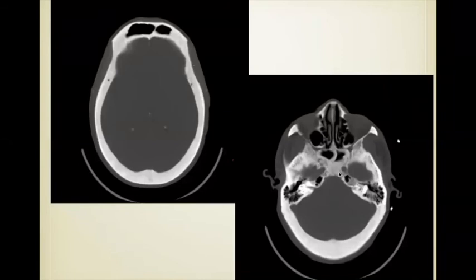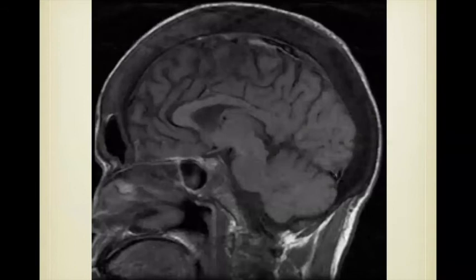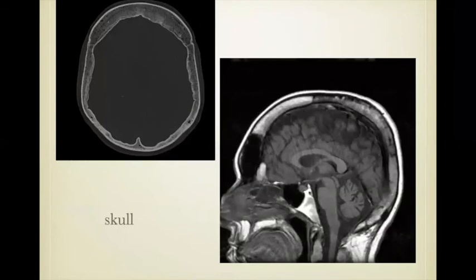Notice how dense the clivus is. Usually, as you'll see, there are fine trabeculae in here. There's also some thickening here in the sphenoid septation. And this uniformly sclerotic skull should be easy to discern if you have the clinical history. This is a case of renal osteodystrophy. Patients on dialysis can get this bone sclerosis and widening. This is a feature of the underlying disease, probably related to the abnormalities of parathyroid hormone.